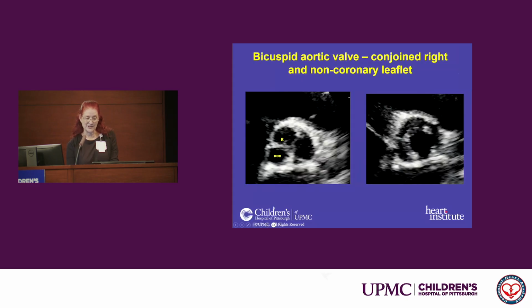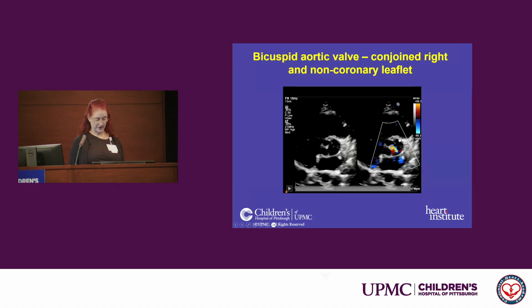The much more common things that we see are the bicuspid aortic valves. And as we've already intimated earlier in today's talk, there's really two patterns that we see. Again, this is a parasternal short axis view, aortic valve, pulmonary valve. So the sinuses facing the pulmonary valve will be the right and the left, and the other one is the non. So here is a right and non, and when it opens, you can see here is that raphe. So it has a wide opening, but it opens vertically. We don't get what we refer to as the Mercedes sign in the trileaflet one that opens normally.